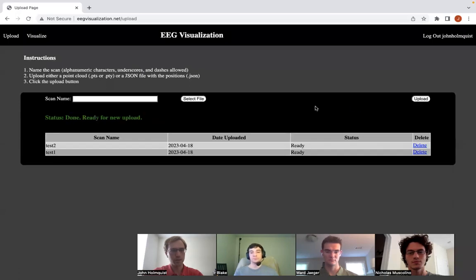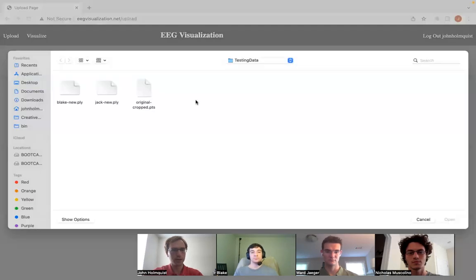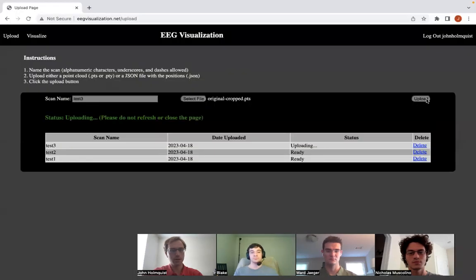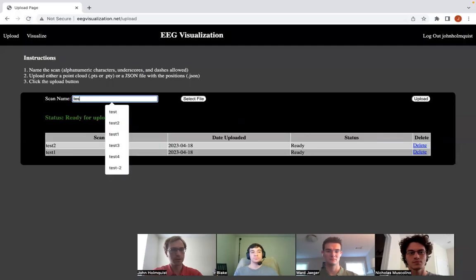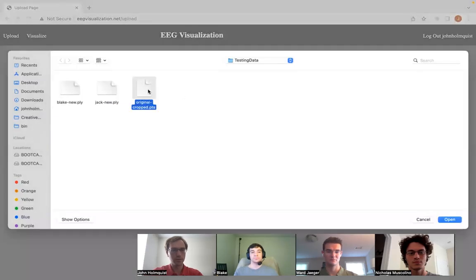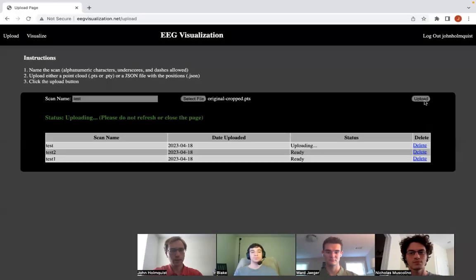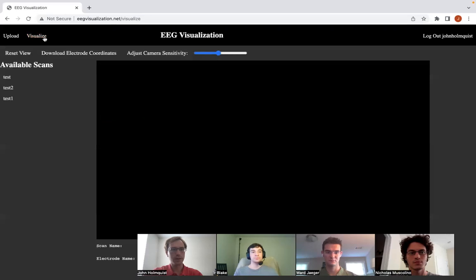So watching this, yep, it worked. So let's finally upload a third scan. This one will be a PTS file, and we will upload that too. Unfortunately, it errored again, but we will just try again. And there it is. So now we can go to the visualize page where we can see all of these scans.